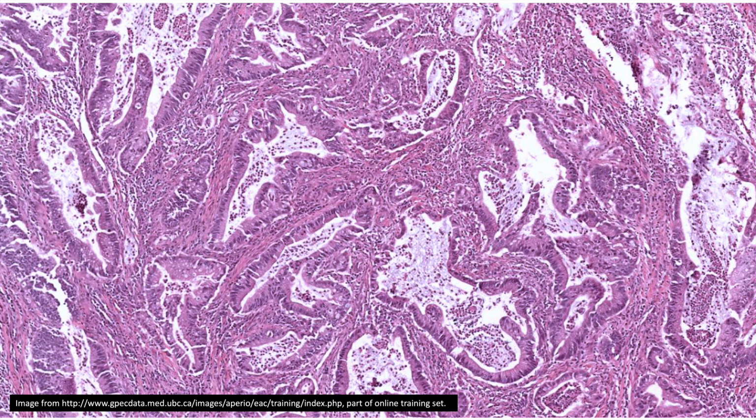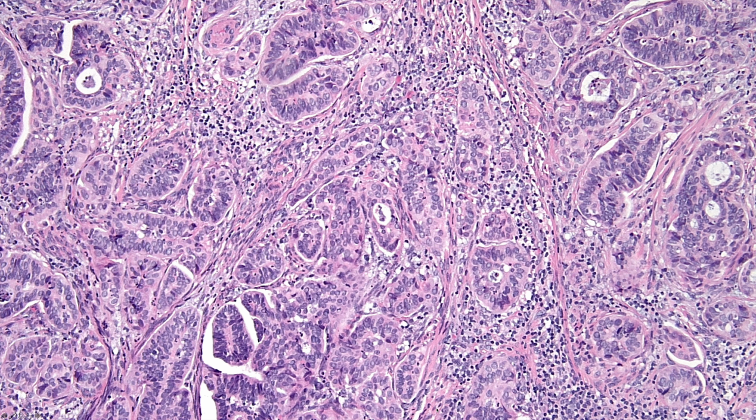And in pattern C, which is here, you can see that the glands show a diffuse infiltrative pattern with abundant desmoplastic response. The infiltrative glands often show irregular or angulated forms, as they do here. And some tumors, not here, but like I mentioned earlier, can have solid growth patterns. This is an example of a case with a micropapillary growth pattern.